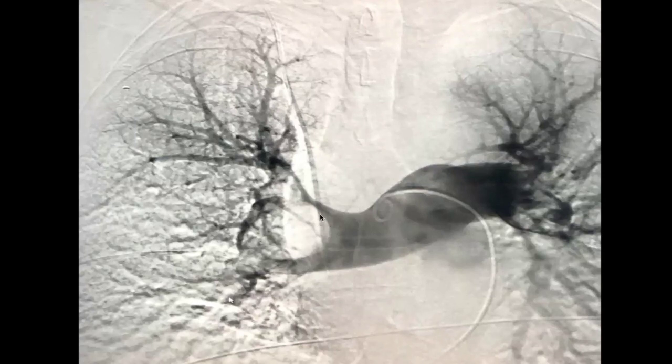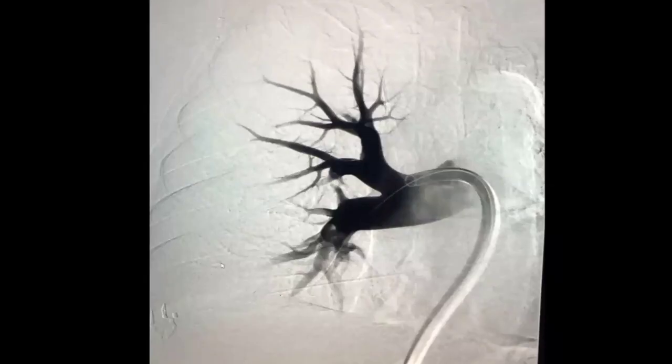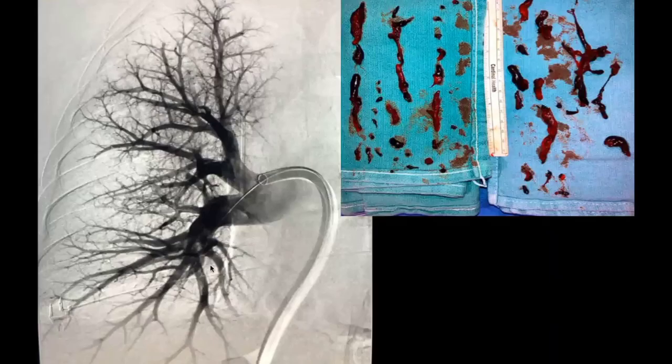So there's this huge clot sat here that is impeding blood flow to almost a quarter of the gas exchange apparatus in the human body. You're not going to be expected to know this, at least in the exam, but I thought I'd show you a PE on a pulmonary angiogram, because on a CTPA you would have got that easily. Okay? Nice. Good.